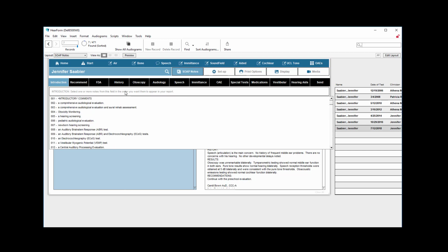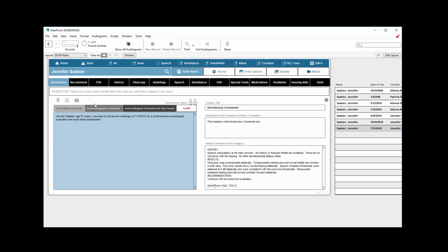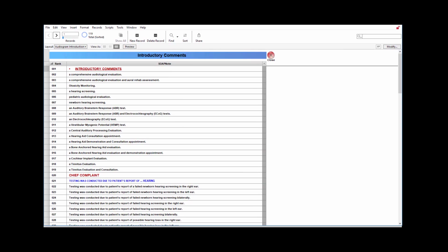These drop-down lists of choices will be a tremendous time saver for you, and you can set those up very easily by clicking this button right here. And I'll make this fit within our video window.